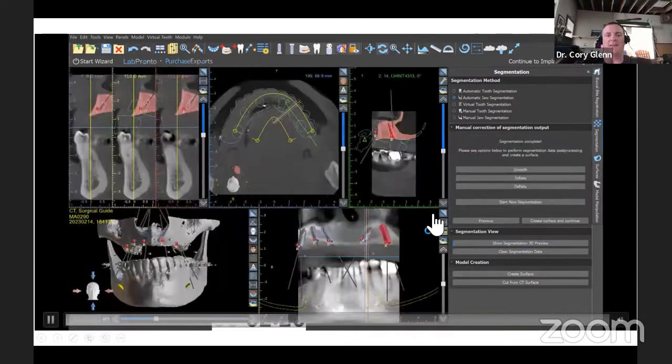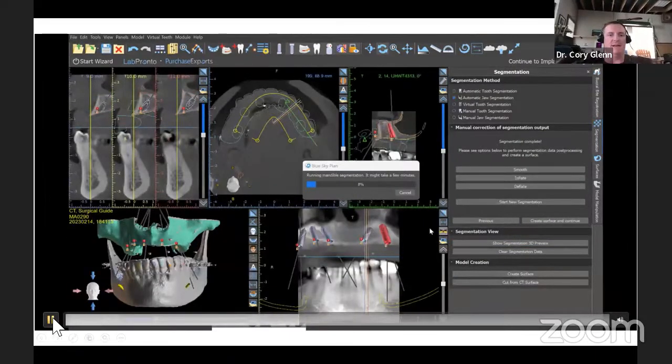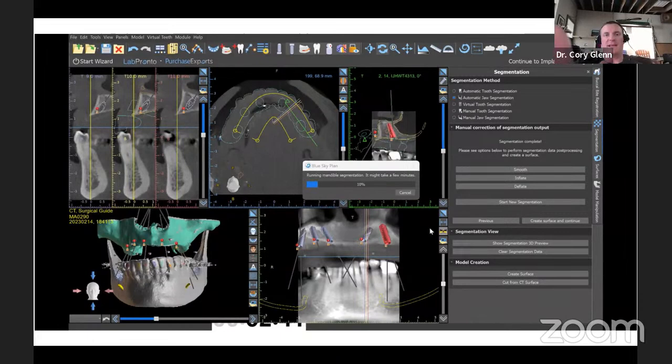And so this is one of the things I really like about this. And I'm going to pause this just a second while I talk about that. That went so quickly because I didn't have to edit it. But, you know, I've used numerous AI segmentation softwares in the past. One of the downsides to them, while they're awesome, is that you just kind of get what you get.